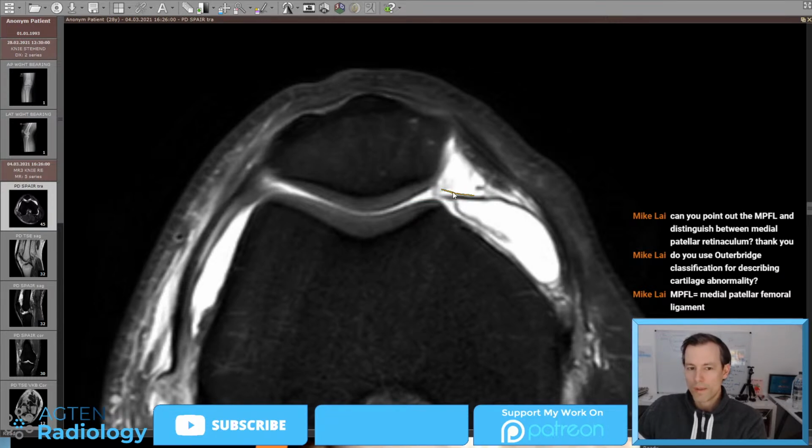It's not so common, and sometimes you get an MR after a resection or debridement of the medial patellar plica, and then you go to the previous MR before surgery and you don't see a lot. So probably sometimes during surgery there might be a little bit of irritation, and then they make this call during arthroscopy, but we sometimes really have a hard time to see this on MR in my experience. And you can always also look for corresponding cartilage damage here on this medial aspect of the femoropatellar joint.